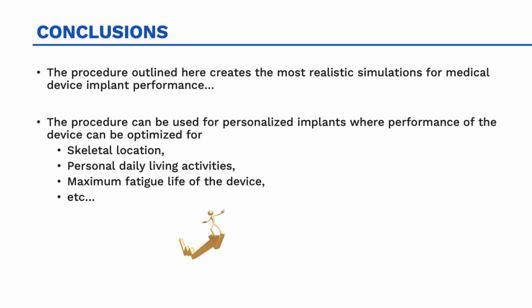So basically, in summary, the procedure outlined here creates the most realistic simulations for medical device implant performance. The procedure can be used for personalized implants where performance of the device can be optimized for skeletal location, personal daily living activities, and maximum fatigue life of the device.